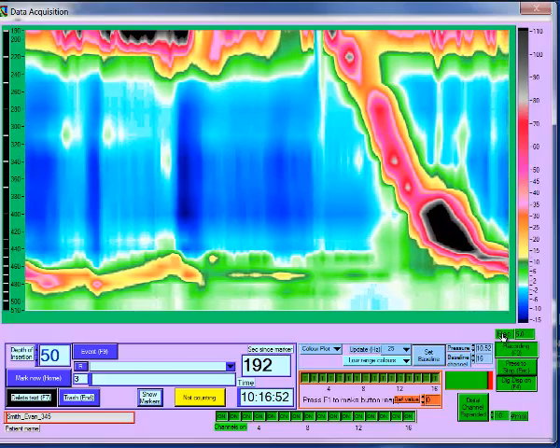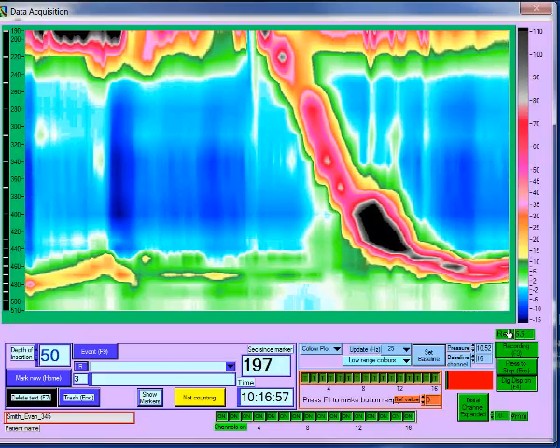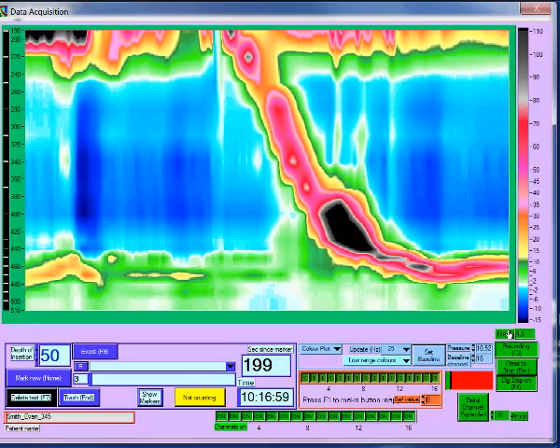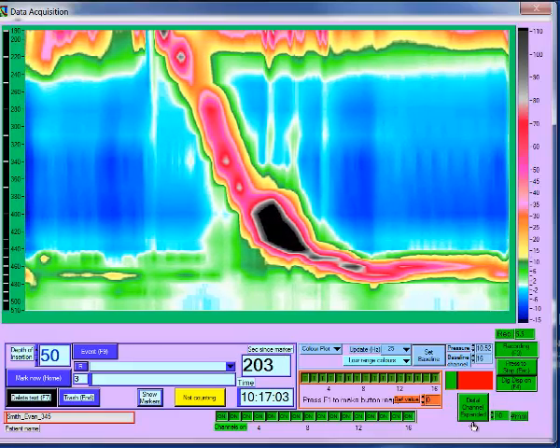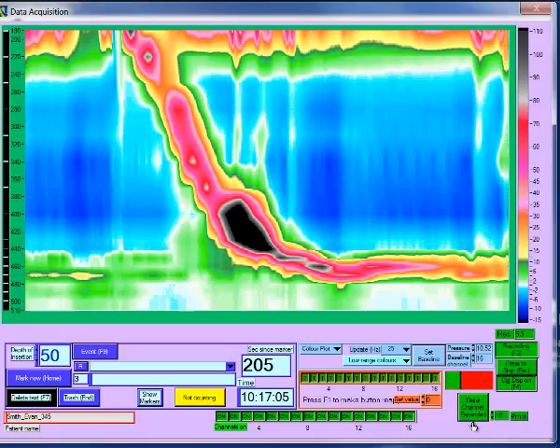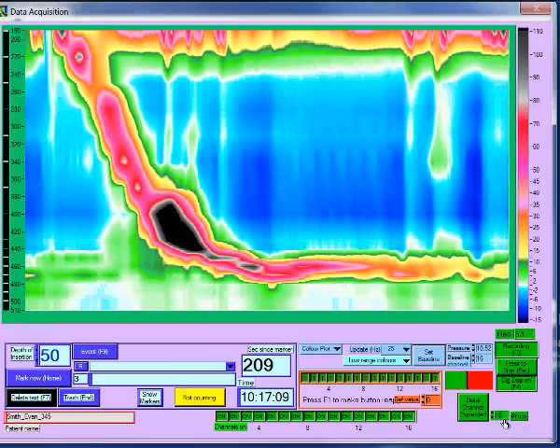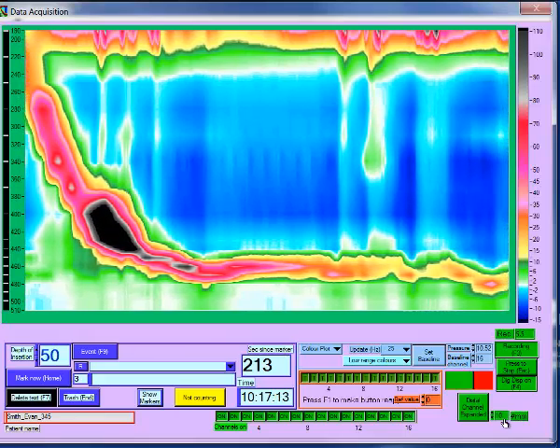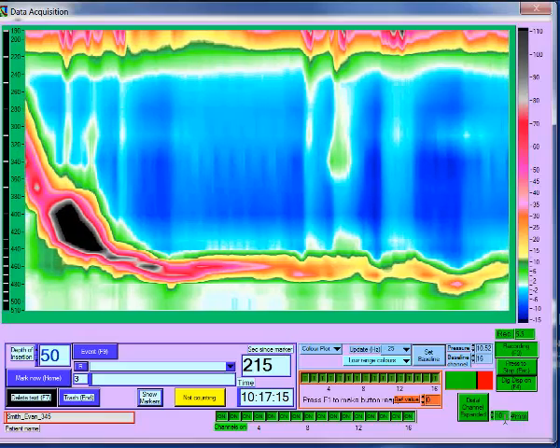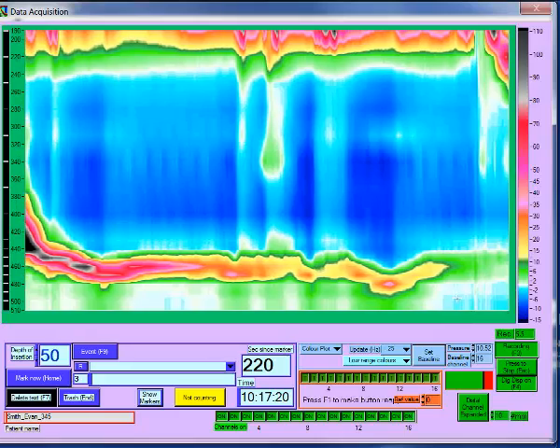The rec display above the recording button shows how many minutes of data have been recorded. The distal channel expanded control expands the data in the most distal recording channel by the number of millimetres displayed. This is purely for visualization and does not affect the data recorded, but makes it easier to see what is happening at the lower end of the catheter.